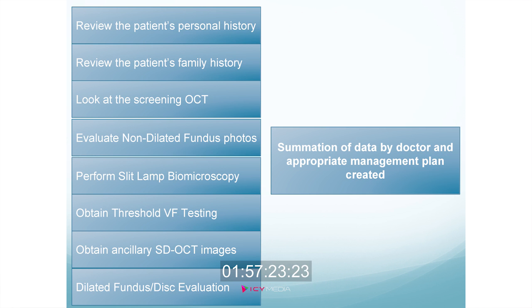Okay? We got a visual field test that showed us the altitudinal defect and really confirmed the diagnosis for us. We did an OCT analysis. We did the RNFL and GCC and got some great information comparing the inferior and superior tissues to each other and seeing how much the actual sick tissue was affected. And then we made a final plan for this patient.